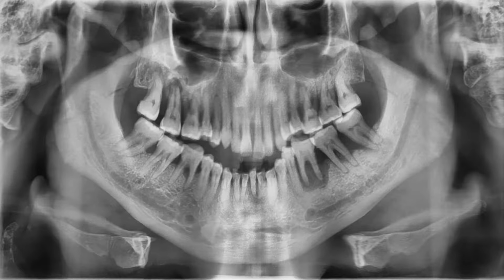Here again, we have a patient with a very prominent smile. So that's the chin is down. Again, anterior teeth are not fully recorded. The posterior borders of the ramus are pointing towards the center of the film. The top of the left condyle is not even recorded, and we can see that the hard palate is pointing downwards.